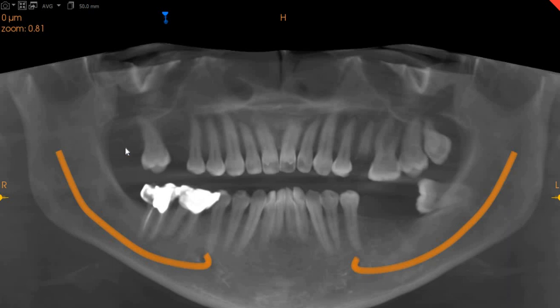Now we've placed implants for the doctor so that they can see each and every segment. So this is the implant placement. There we go. These are all the implants we've placed, the Iris Evolution implants. These are prosthetically driven implant placements, which means that the crown portion has been factored in on these implants. So here we can see that enameloplasty of the 7 will definitely be needed, or endodontic treatment and a crown later on will be needed in order to support a crown on the 6 when the implants are placed.